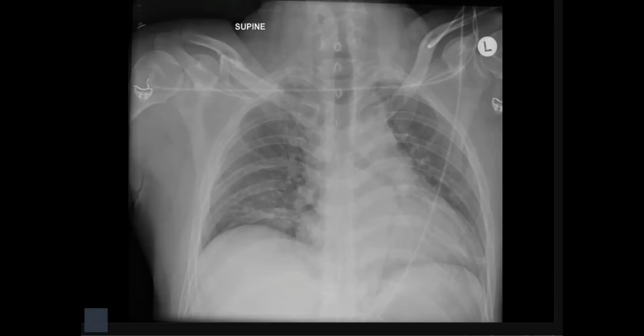But as the patient fell from height and has right-sided chest pain, do you see any irregularity here? I know it's subtle, but you see it here. Small, and also some bone fragment here and some irregularity. So suspected rib fractures. Agree, my friend. It's a clavicle fracture, suspected rib fractures.